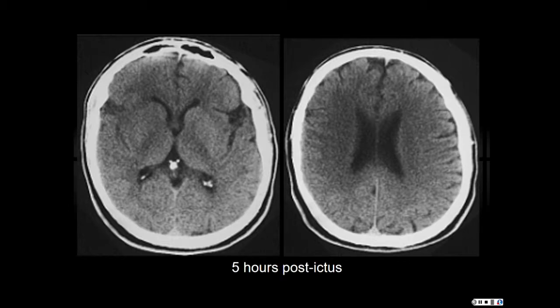Sure. These are the lenticular striate branches, which in my experience mostly come off of the proximal aspect of the MCA. Is that what they're still learning? Okay. I want to make sure I'm not overstepping or that you're comfortable with that.